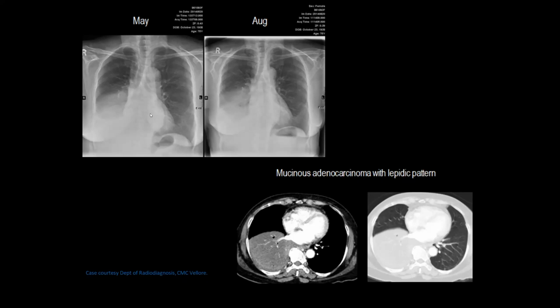So you can see this patient has a beautiful lobar consolidation limited by the fissure, in the lower lobe. And then you can see that there is effusion also. This was in May and this was in August. You can actually see the air bronchograms inside the area of consolidation. It is more or less static. It's not resolved. It should have resolved in 3 months with therapy.